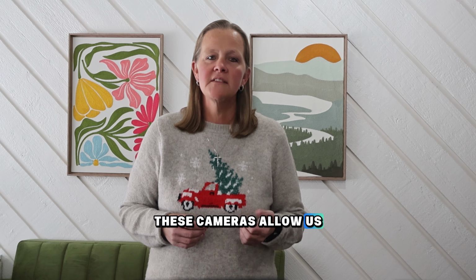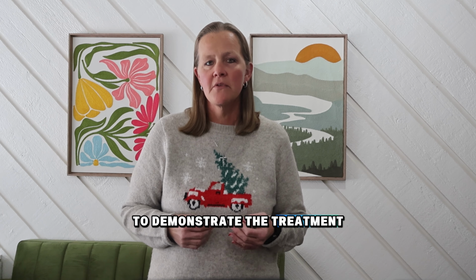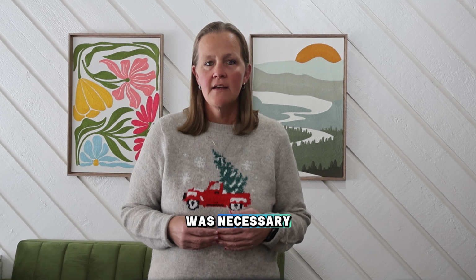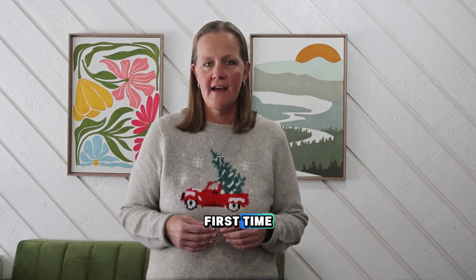These cameras allow us to capture images for a variety of reasons. One such reason is for insurance claims. We can attach these photos, along with required x-ray, to insurance claims to demonstrate the treatment provided and why it was necessary. This helps ensure accurate, expedited claims processing the first time.